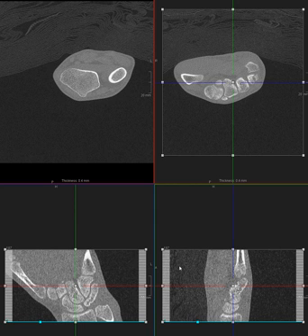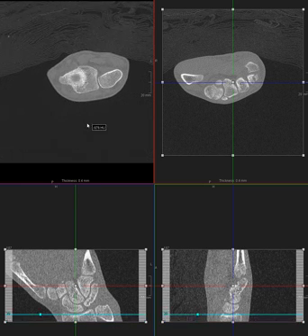This is a video to try to help describe what surgeons are looking for when we reformat according to the scaphoid. So if someone requests scaphoid views, 2D MPRs of the scaphoid, what do we do? Well, this is how we normally will acquire images.